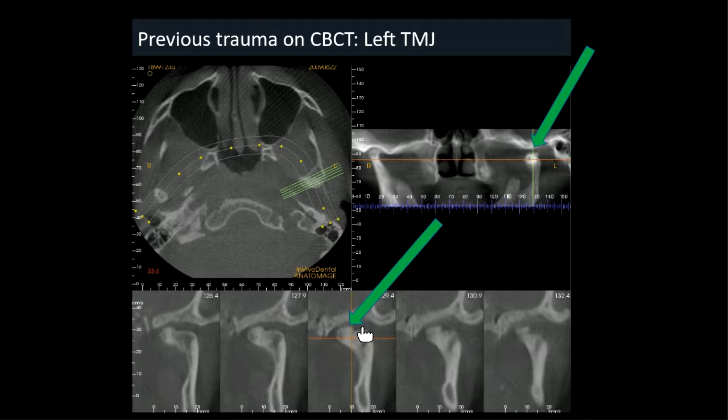Most of the time, you don't have to treat these things. It just fuses over time, and yes, you do have a problem with the joint and the temporomandibular joint disorders. So it is very interesting how they treat these things. So basically, they don't do any surgical intervention in this area.